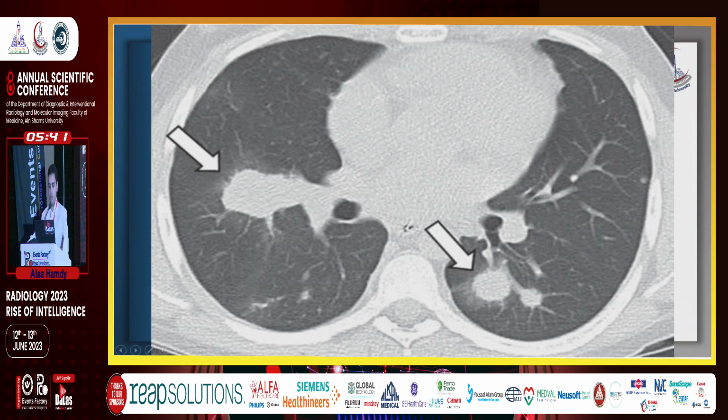CT scan here shows multiple nodules with a surrounding halo of ground glass. Percutaneous CT guided biopsy confirmed the diagnosis of post-lung transplantation lymphoproliferative disorder.